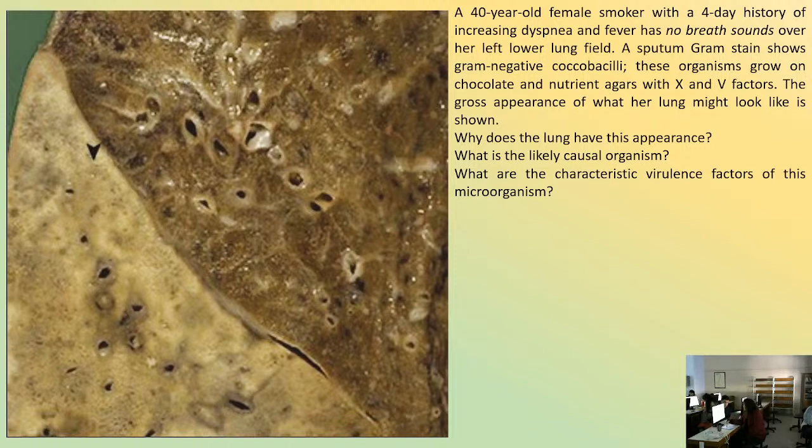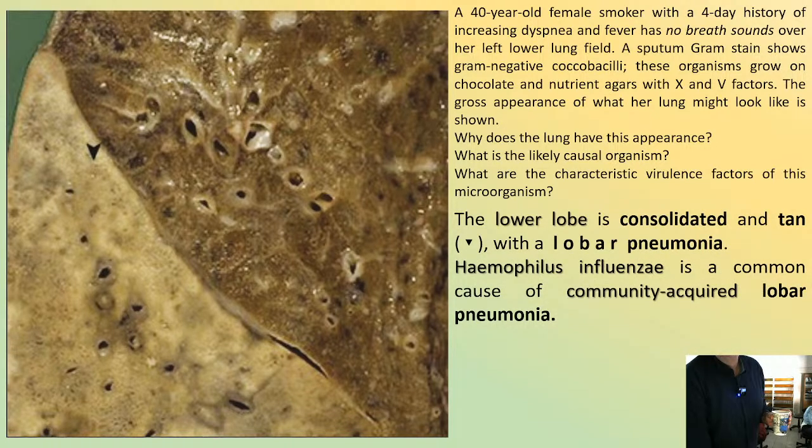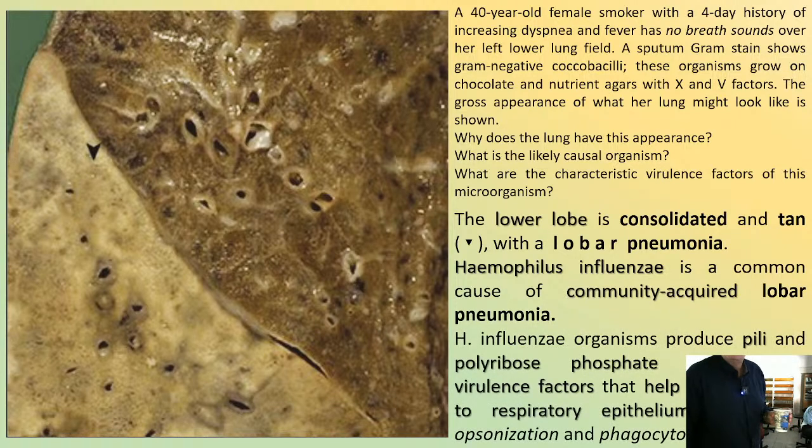So these are signs of bacterial pneumonia. So you can study which are the most common causes of lobar pneumonia, where a whole lobe is out of function due to the inflammatory infiltrate. So this is a case of pneumonia. You can see bronchi, not particularly inflamed. However, the peripheral airways, the alveoli, are consolidated.